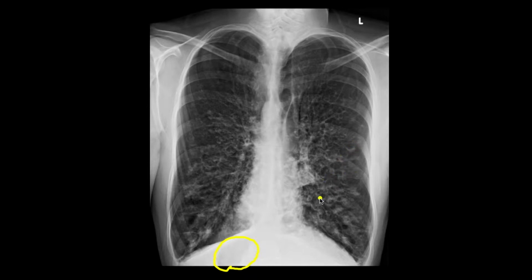If we look at the lung fields in this patient as well, you can see these multiple ring shadows all the way through, these coarse ring shadows, some of which, as you can appreciate here, actually have a fluid level. This is the appearance of cystic bronchiectasis, such as you'd see in cystic fibrosis patients, but it's a characteristic appearance where you have cystic bronchiectasis and situs inversus, and that's characteristic of a syndrome called Kartagener's syndrome.